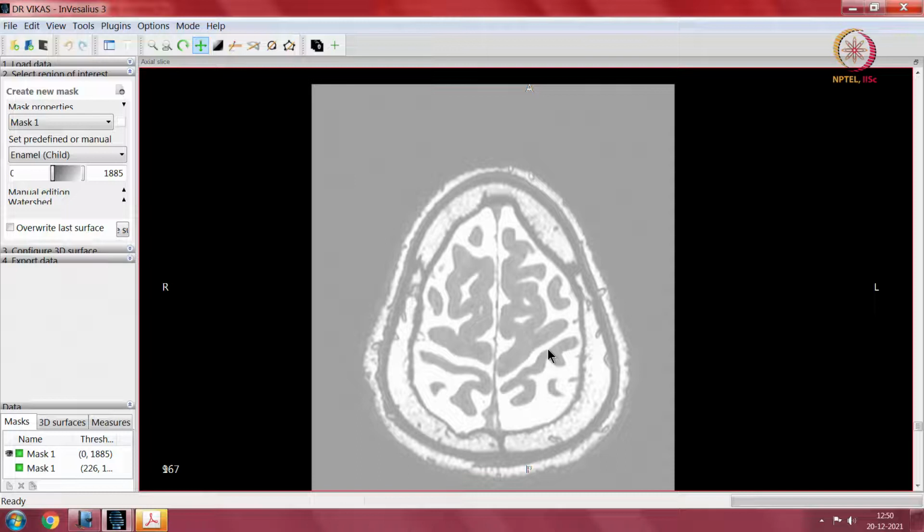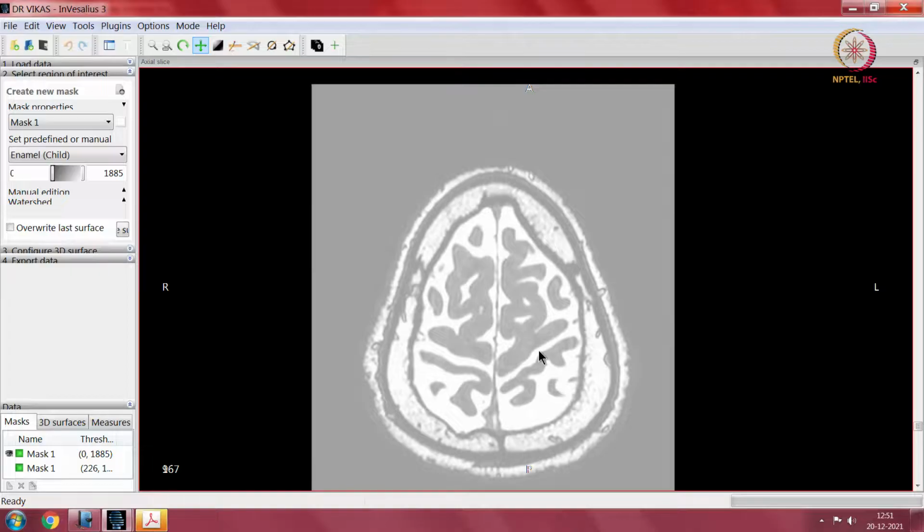They are not strictly rigid, because acting, as in implementing, includes judgment, decisions, thought; everything is an action, and that is what is happening in the anterior part of the brain. So, going back to the image, this is the central sulcus.